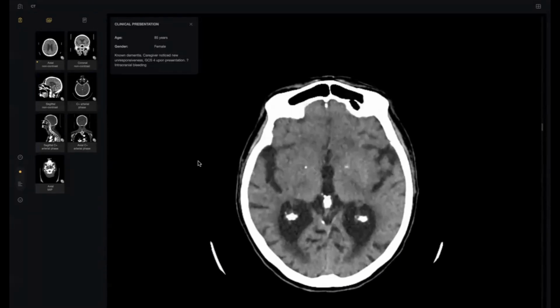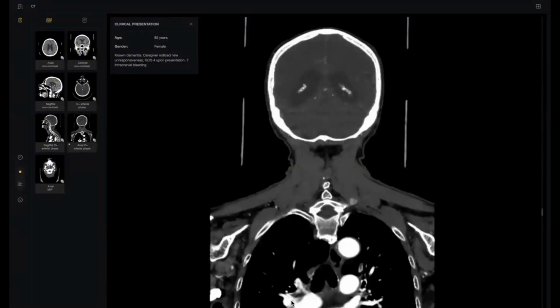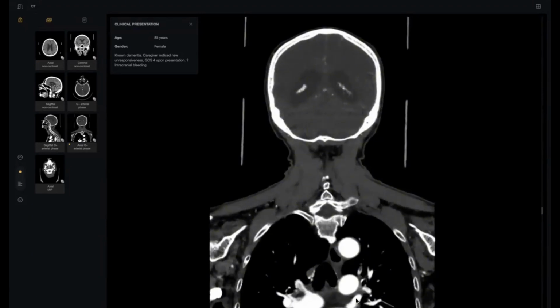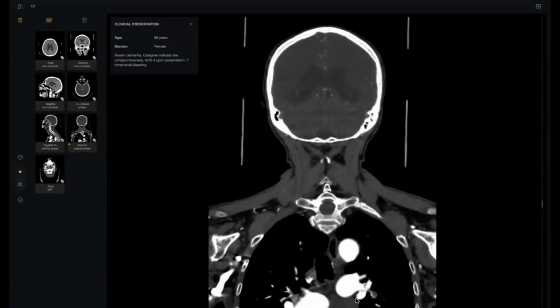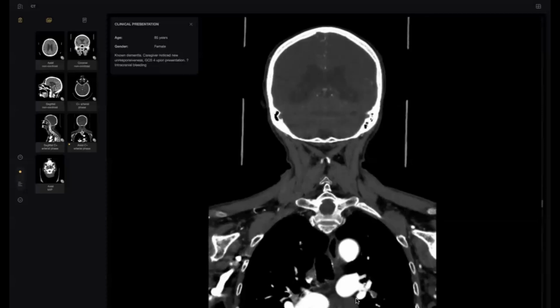How come, doctor? Don't tell like this. This is almost the source. This is the source: pulmonary embolism. Yes. This is pulmonary embolism, complicated by thrombosis in the right internal carotid and right vertebral artery.